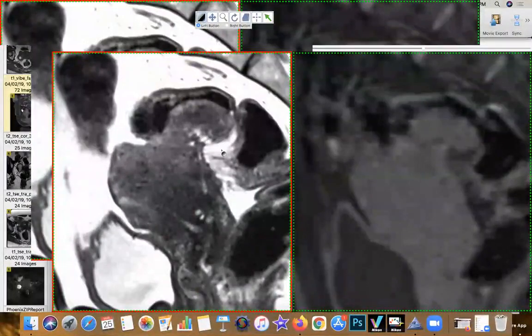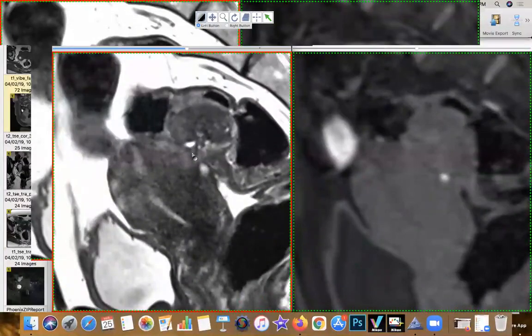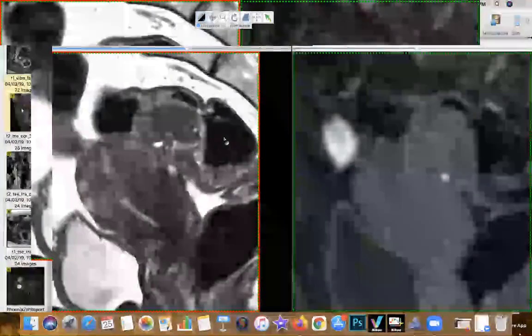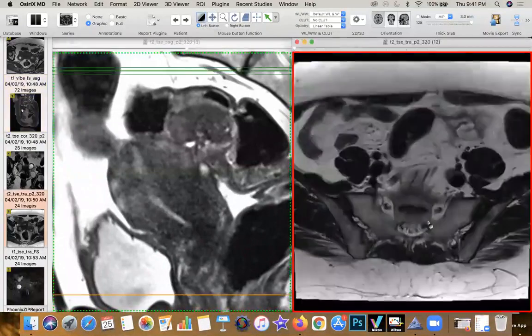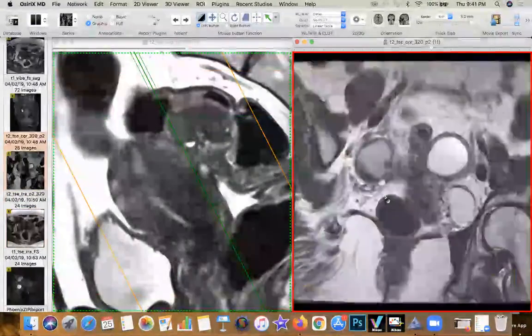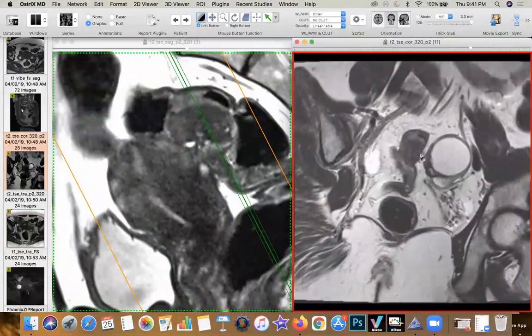the lesion is not arising from the rectal wall, but actually the lesion is arising from the posterior serosal surface of the corpus, and it has kind of tethered the anterior rectal wall and infiltrated the rectal wall at this location. So I'll move it onto the axial images, and you'll see what I'm going to show you all. Actually, it'll be seen best on the coronal. I'll just move it up. And you can see this lesion sitting within the rectal lumen out here.